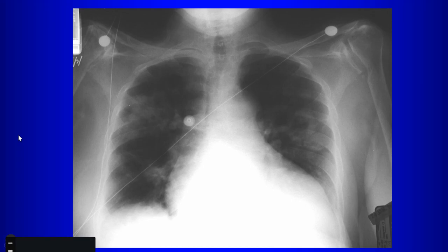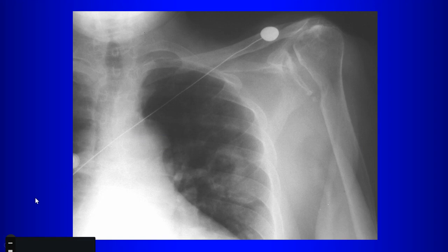All right, so the lungs look normal? Yes or no? No, what's wrong? Peripheral opacities. Yeah, peripheral opacity. One or more than one? Multiple. Right, so there's more than one. Here, I'll give you a close-up of that opacity. Anything to say about it? Yeah, it's cavitary. Surprise, we have multiple opacities with cavitation.